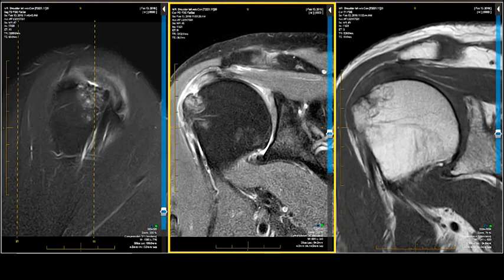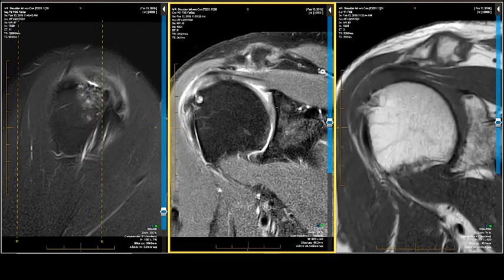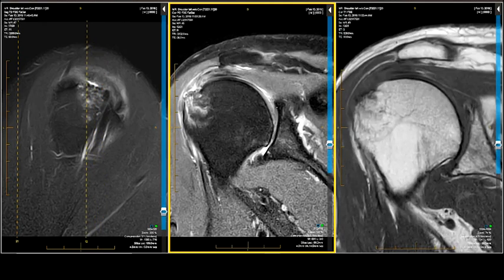Number four, mild or at best moderate osteoarthritis of the glenohumeral articulation with chronic degenerative tears and/or fissures of the anterior and posterior labra and mild conformity change. That's how that case would get read.